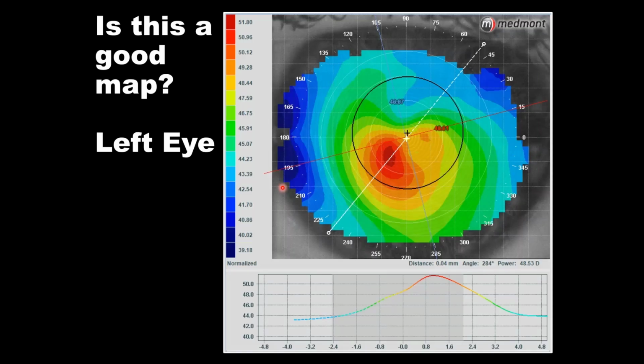Here we have another keratoconic patient. Steepest here, flattest here, separated by maybe 4 millimeters. Now, is it possible that this is topographical error? Could this little divot or flat spot in the eye that's within a millimeter of the steepest spot be indication that we have some kind of topographical error due to corneal staining, corneal scarring, poor tear film?